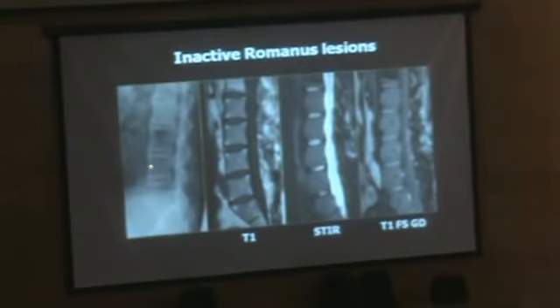On the X-ray, we can see already those very thin syndesmophytes, which we're going to talk about later, as well as large, wide ankylosis in the facet joints.